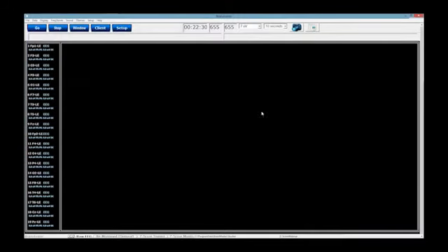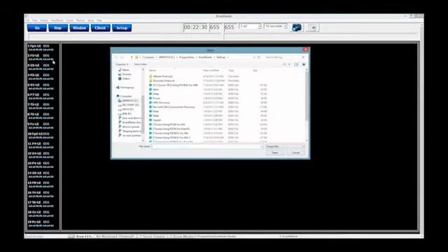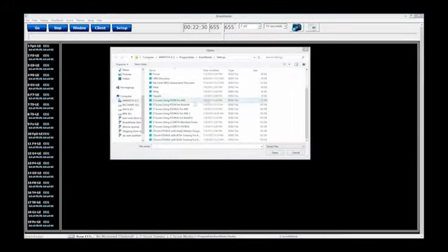The next thing I do want to get into is something that is unique to the BrainDx, because with BrainDx we not only have surface Z-scores, but we also have sLORETA Z-scores, which is basically a 3D image or a 3D training of the Z-scores, of course, on live settings. So I'm going to go File, Import Settings. What I'm going to cover right off the bat is that we have two protocols that we designed as a default for BrainDx sLORETA. One of them is Z-scores using sLORETA Absolute Power, and one of them is Z-scores using sLORETA PZOK-UL.